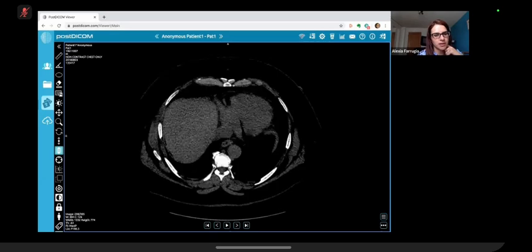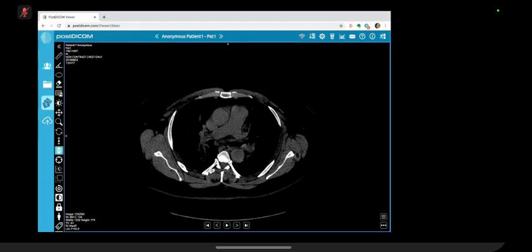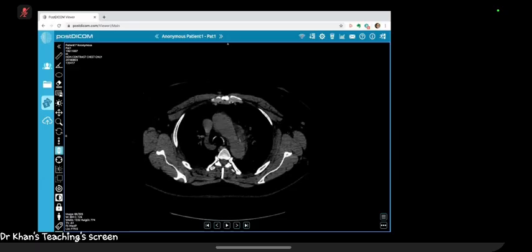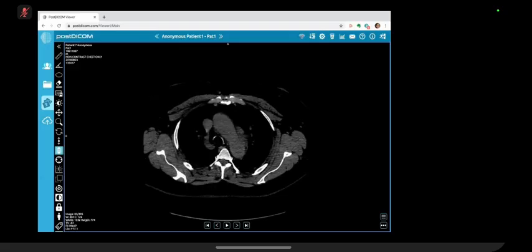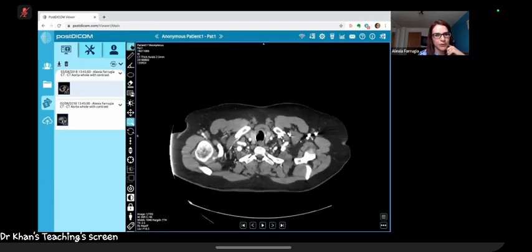Did anything catch your eye, incidentally? Yeah, there was a bit of hyperdensity, and I think there was atherosclerosis with mural hyperdensity, basically intramural, and slightly proximally there was a focus of calcification. I think atherosclerotic. I was just wondering whether there's a penetrating ulcer there. The adjacent fat was a bit stranded, so obviously we'll see in the proper windows, but definitely there is an intramural hyperdensity suggestive of... Okay, great. I wasn't sure it was projecting very well on your end.